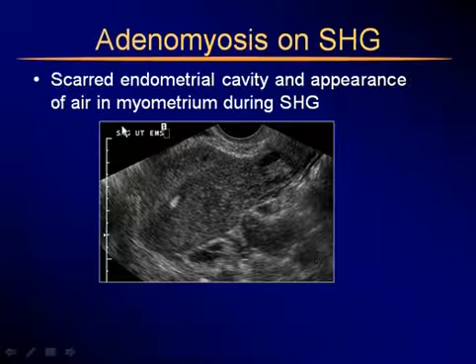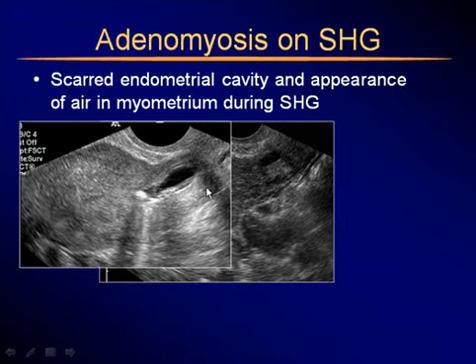In some cases, it may be impossible to distend the cavity, especially if it's been scarred. And sometimes it's the air that actually may help you during the sonohysterogram.